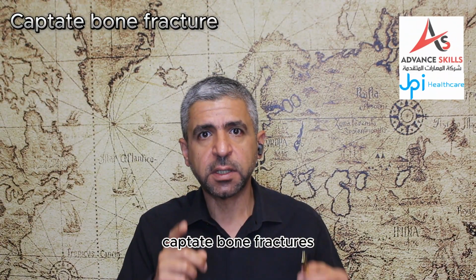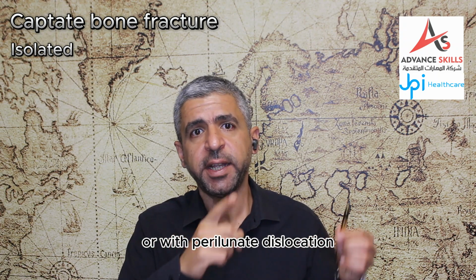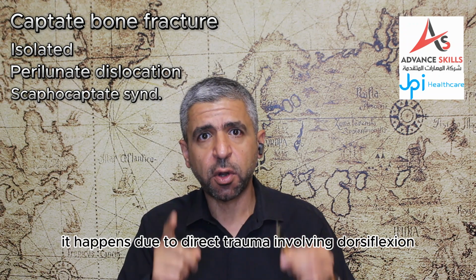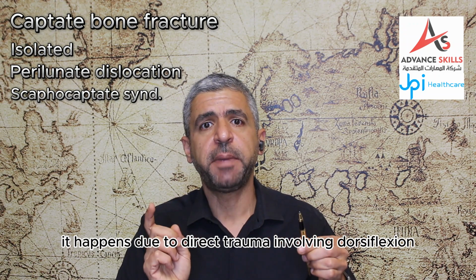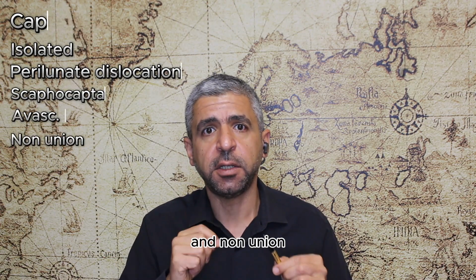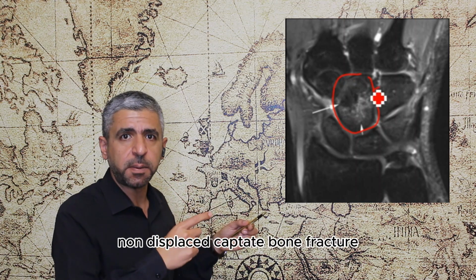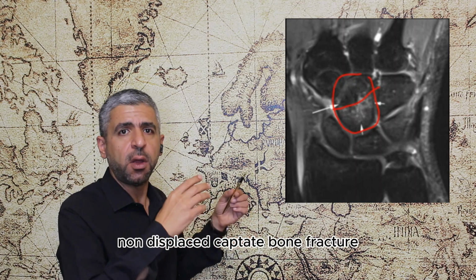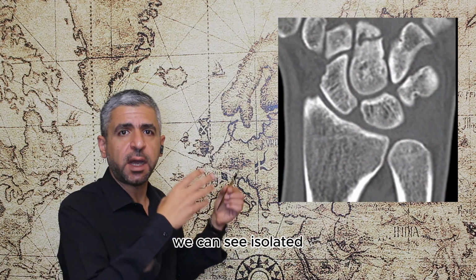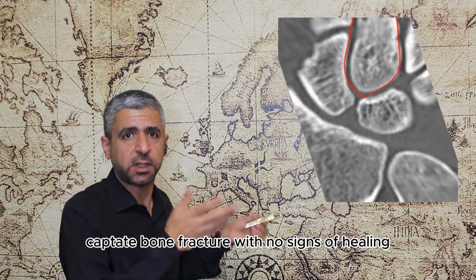Capitate bone fractures can be either isolated fractures or with perilunate dislocation, called scaphocapitate syndrome. It happens due to direct trauma involving a dorsiflexion mechanism. Complications include avascular necrosis and non-union. Like in this example, we can see an isolated non-displaced capitate bone fracture with some surrounding bone marrow edema. Also, on the CT scan, we can see an isolated non-displaced capitate bone fracture with no signs of healing.